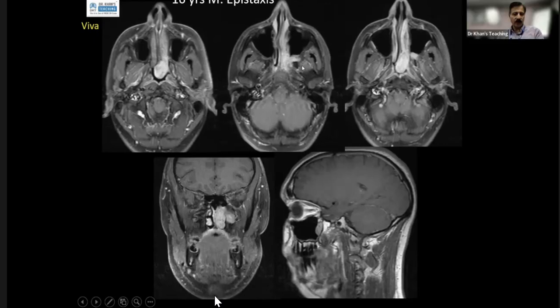Now, this is the masticator space, the nasopharyngeal masticator space. Now, the pterygopalatine fossa opens here. So, what do you call this opening? If it's inferior, then we'll call it Vidian canal. I'm talking about lateral. Okay, lateral is foramen rotundum. Lateral. You see, you are confusing because I'm not asking that right now.